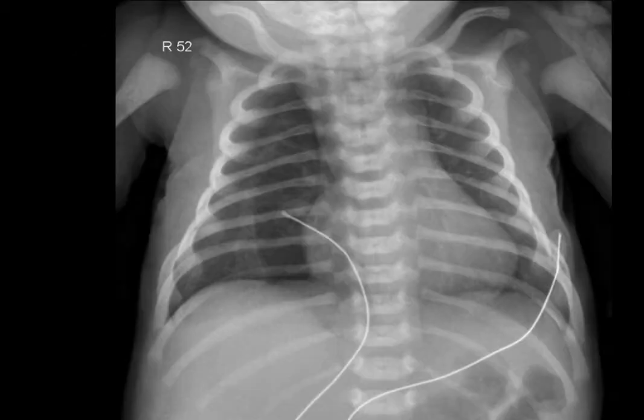They didn't do a decubitus film, but this is that same patient the very next day, and now instead of being diffusely anterior to the lung, now it's all medial, and you're seeing the medial edge of the right lung as well as a very sharp right heart border. So it went from being a, quote, unilateral hyperlucent hemithorax to just a medial hyperlucency.